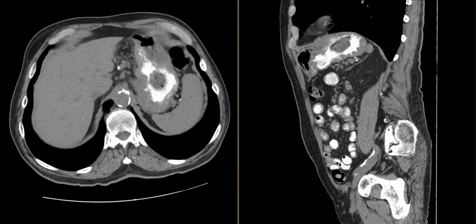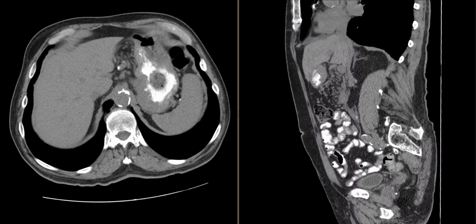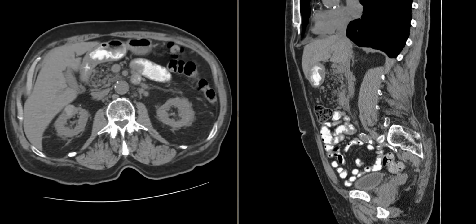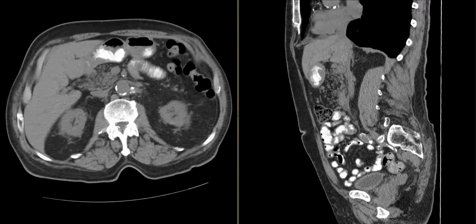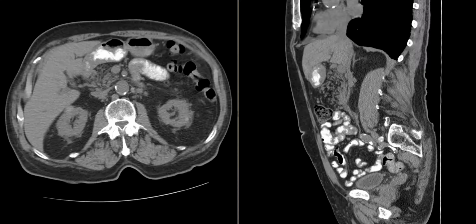So we had this weird thickening up here in the cardia. The cardia, yeah, I have a hard time. We've seen cases of GE junction cancer, exactly, and then we see that thickening. And then even down here near the antrum pyloric region, it's like, are these just folds? Is it a little contracted? But looking at the sagittal here, is this some sort of undermining of a mass in here? So all questionable because it could just be ingested material.